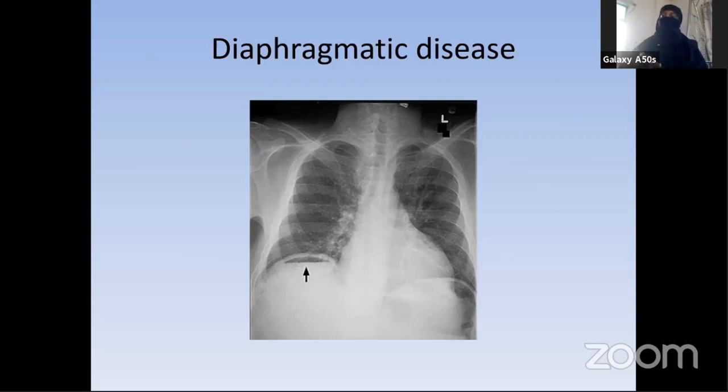So anything producing the loss of the acute angle, what we used to call blunting of the CP angle, is present here. You can see this hemidiaphragm is lost here. It should reach here, the same as this level. You will get a similar level. It should sharply reach the lateral chest wall. Rather, it is lost earlier, and the CP angle is not as sharp as we used to expect and as seen on the opposite side.